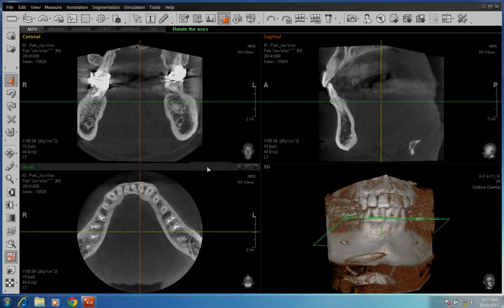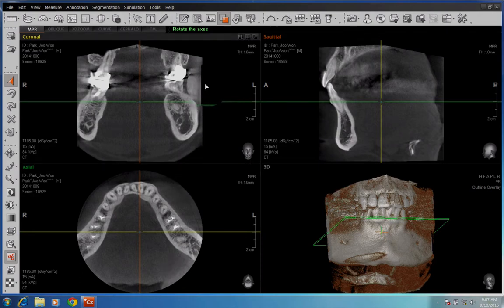So basically, I want you to be familiar with this orientation before we start manipulating or doing anything. I want you to be familiar with the basic layout of the tools that we'll be using. I realize there are many other tools that you can use, but my main focus is on the basics, so I want to teach the basics of how to use this software.